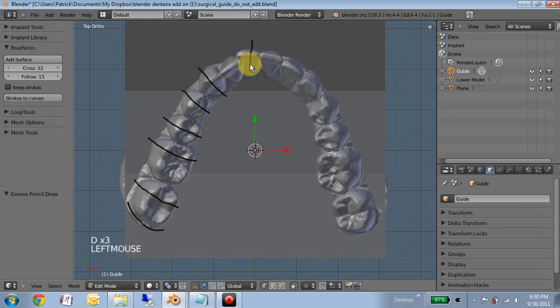We can probably skip a few once we get up here. Get the canines. There are probably easier ways. We could have a template geometry that we could adapt, but this is pretty flexible.